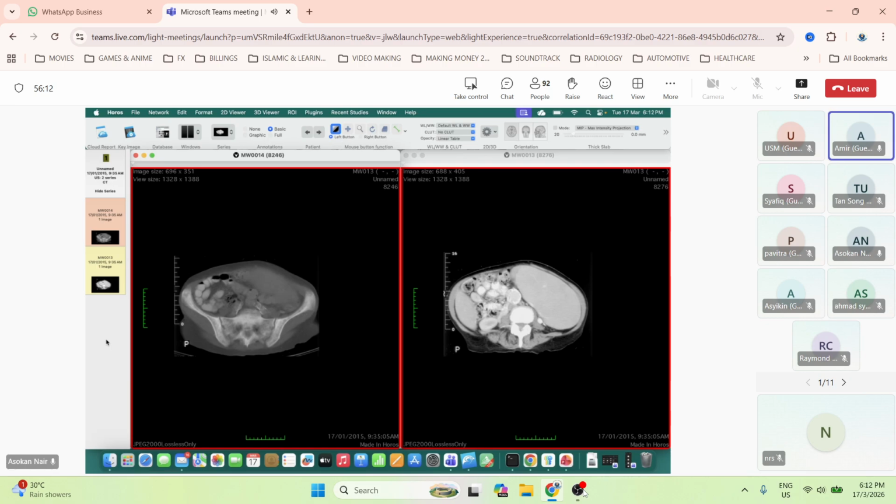So my provisional diagnosis would be a nerve sheath tumor or a retroperitoneal metastasis. Okay, so I know this is just spot images, difficult, but in the exam you'll be given a stack, so you'll know where it comes from. But never mind, just to test your thinking.